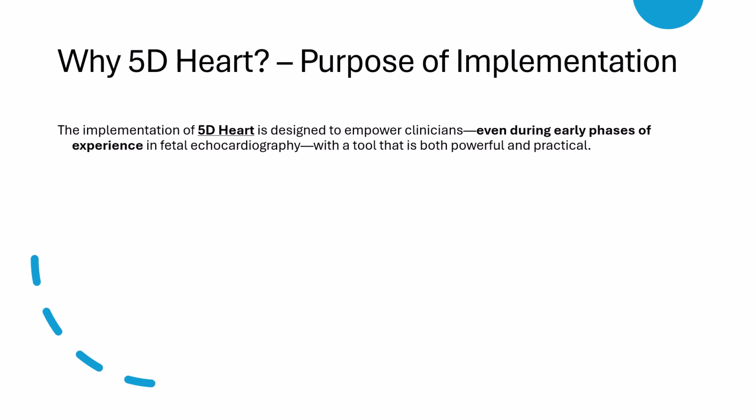The short answer, it was designed to solve real-world problems that clinicians face daily, especially those who are still mastering the complexity of fetal cardiac evaluation. 5D Heart is built to empower users at all experience levels by delivering standardized, high-quality diagnostic output planes with minimal effort. Here is what it brings to the table.